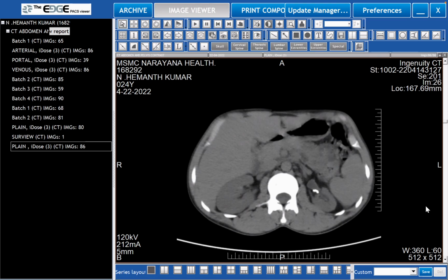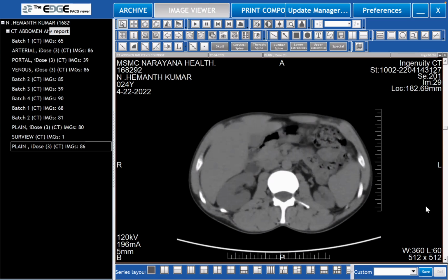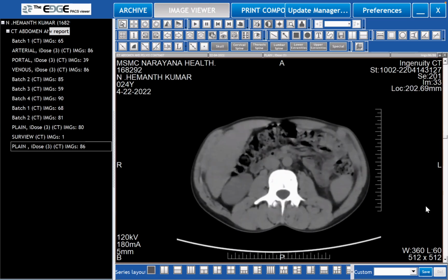So you look at these films and you see, go down. I don't think we can yet. Can you scroll? Are you back?